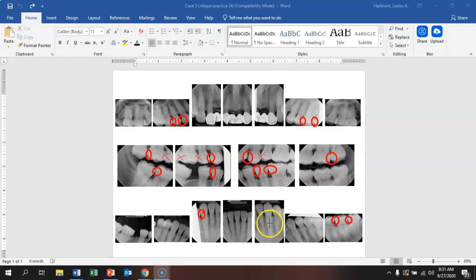I think that's probably a little bit more than 50. Well, I think that's on the border. It's just too hard to say without being able to enlarge it like we would in VixWin.